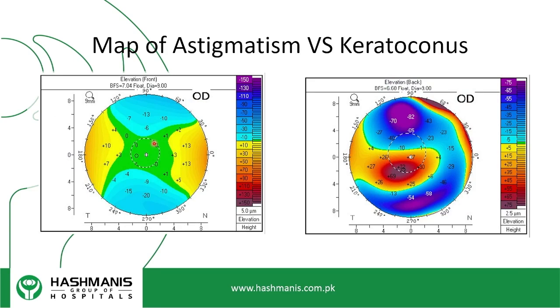Now, if you see the map of a normal astigmatism versus the map of a keratoconus. In the sagittal curvature, you've got a steep axis and a flat axis. Now remember, the sagittal curvature or tangential curvature, whatever curvature you're talking about, is actually just a derivation off of the elevation data. So if you see, the blue areas would be the steep axis and the red areas would be the flat axis in terms of the elevation, and if you convert it to sagittal curvature.